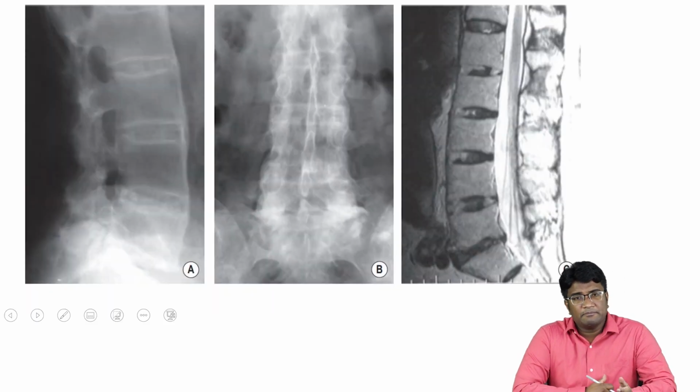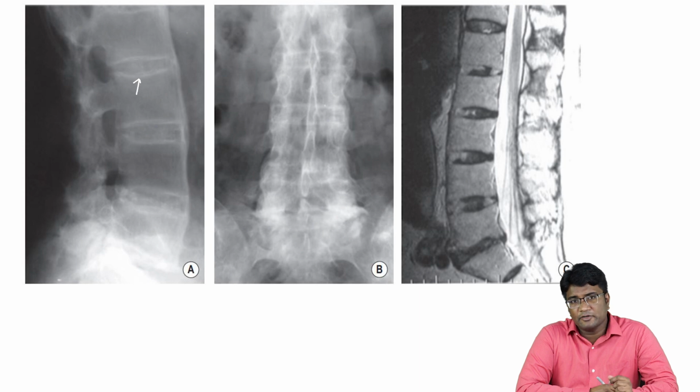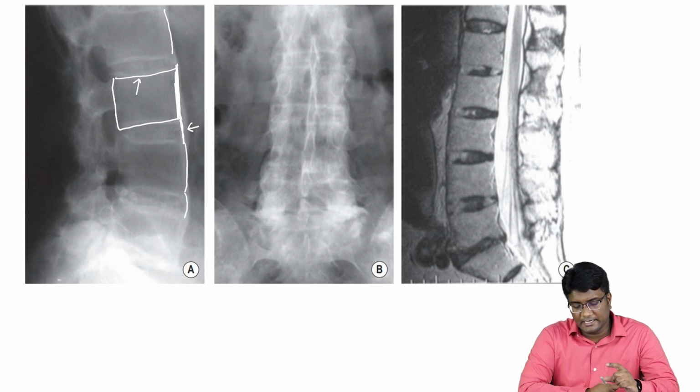We all know some important radiographic findings of ankylosing spondylitis. Please look at here again. There is sclerosis and decrease in height of the intervertebral discs. There are syndesmophytes. There is ossification of the anterior longitudinal ligament, mineralization under the anterior longitudinal ligament, producing a more squarish appearance of the vertebra. There are vertical syndesmophytes that occur, right? All of this indicates ankylosing spondylitis.